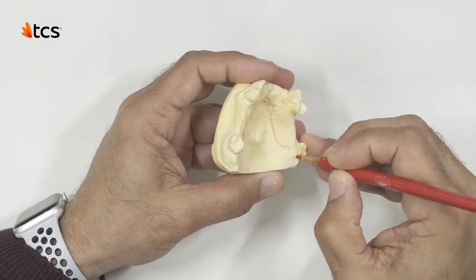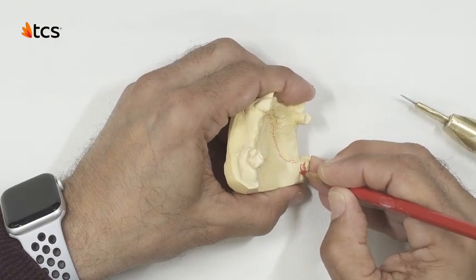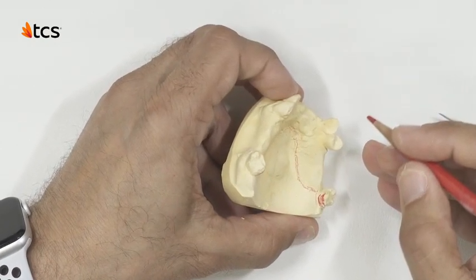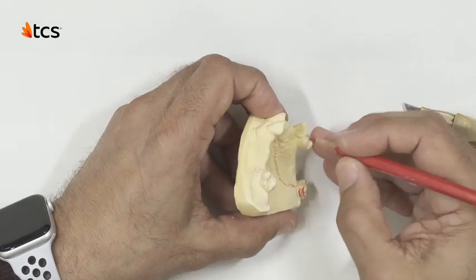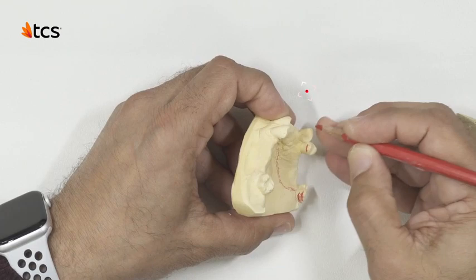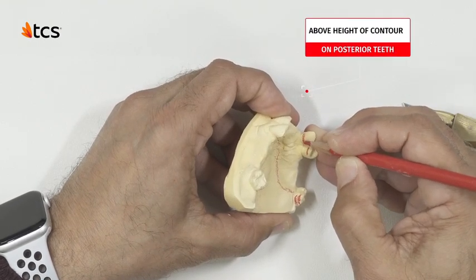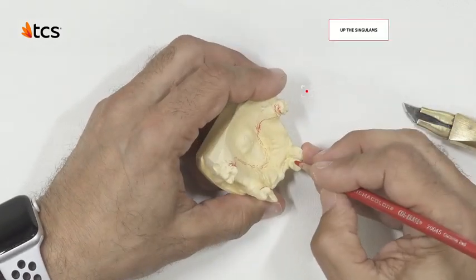We will utilize the same finger clasp design on the buccal side of the molar. Since it is not an area of aesthetic concern, bringing a finger clasp to the height of contour is advised. A standard rule when designing the lingual portion of the abutment teeth is to go above the height of contour on the posterior teeth and to the cingulums on the anterior teeth.